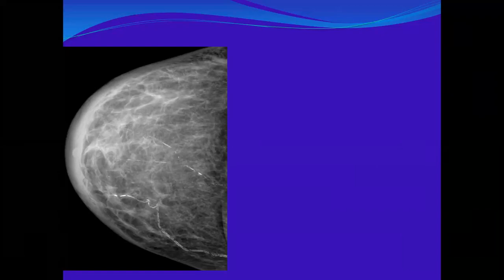I need to do an ultrasound type. Before that, I have to go deep into the history. Any fever to suggest inflammatory mastitis? No. Okay, so I have to sort out inflammatory type of carcinoma.